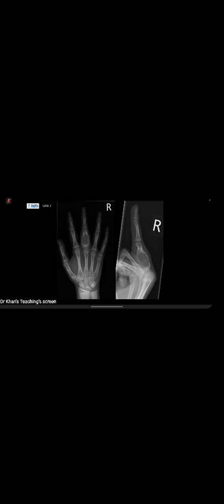And so, would you be saying this is aggressive, non-aggressive? Would you be suggesting anything else? So it is a lucent lesion, and since there is no periosteal reaction or soft tissue abnormality on the particular radiograph, I won't be able to comment. I would suggest cross-sectional imaging, particularly an MR of the lesion, to comment upon its aggressiveness and further involvement of other structures.